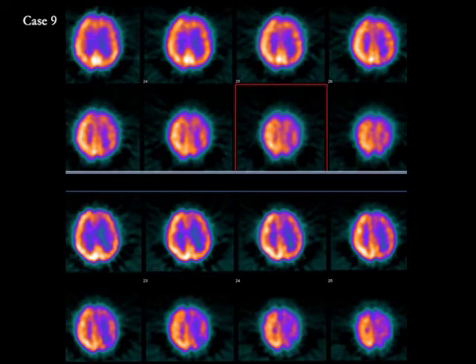So we have two studies on the same patient here on case number 9. Transaxial images on the top and transaxial images on the bottom. The images on the bottom have been acquired using Diamox, which was injected as a vasodilator before the SPECT, and it produced a perfusion defect in the left cortex compared to the right, and on the resting study without Diamox, the defect fills up. So there is compromised cerebrovascular reserve on the left compared to the right, which was exposed on the brain SPECT using Diamox.